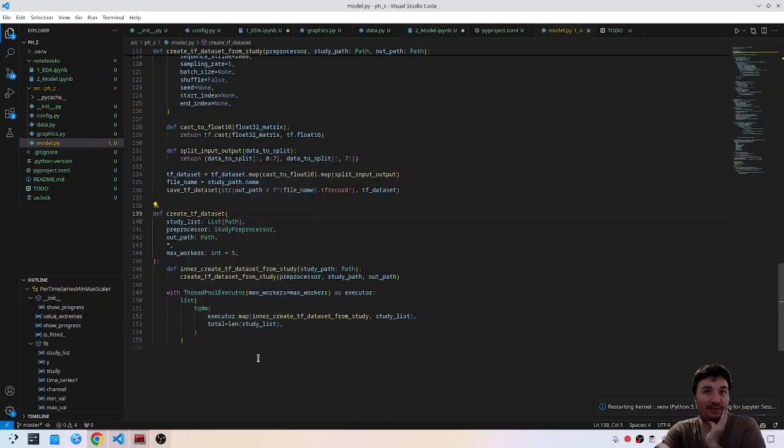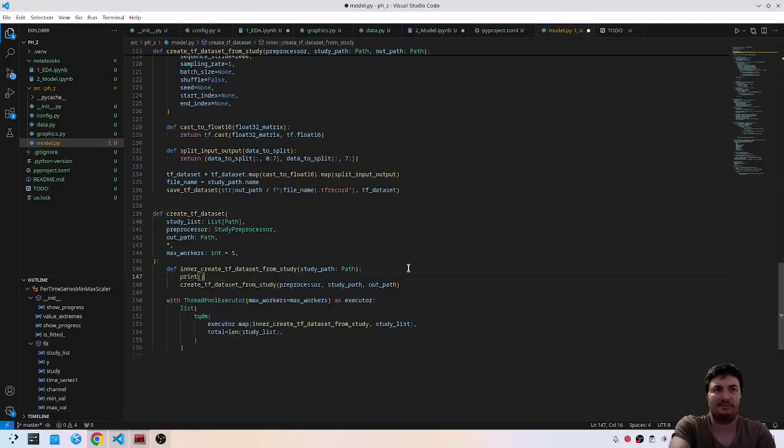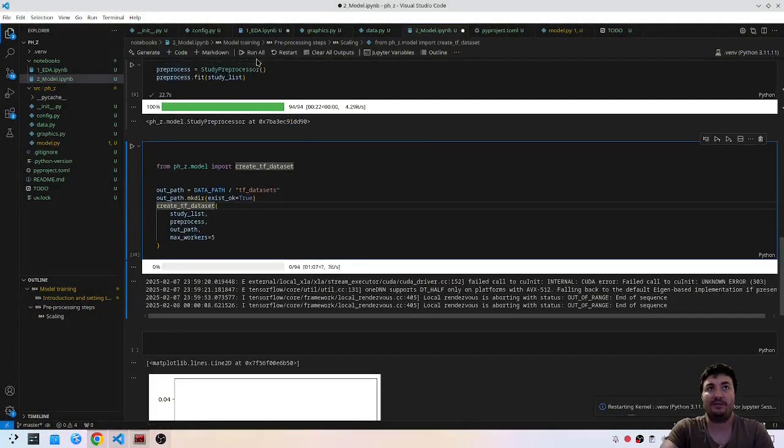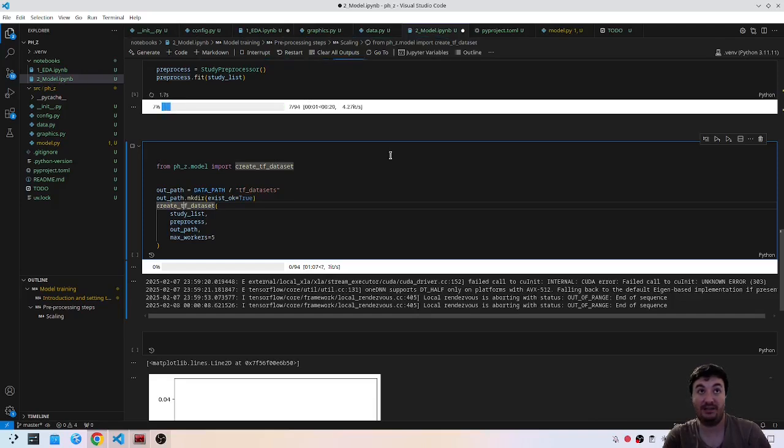So I had to use a processes list. Oh, inside here. Oh, I really don't want to. I can just pickle the preprocessor.